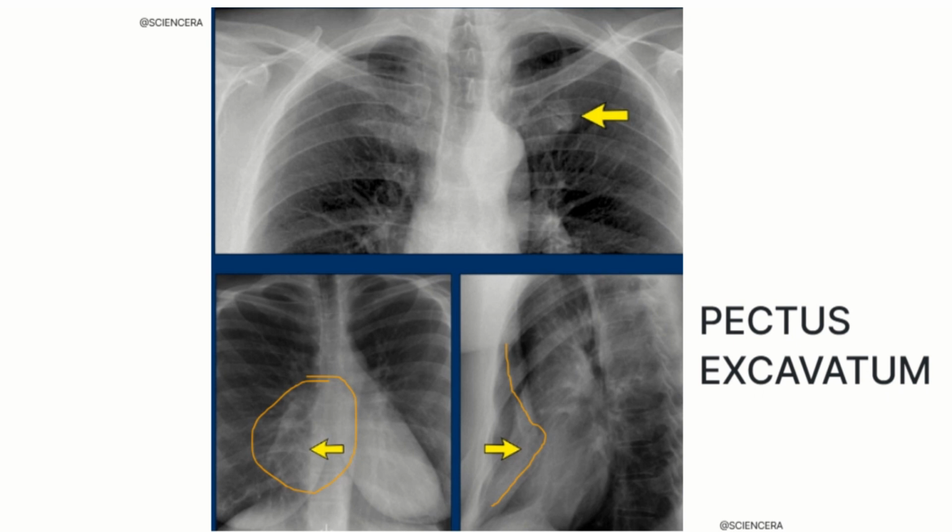the chest is shaped. Pectus excavatum again is something some people are born with, and while it might look a bit odd on an X-ray, it's not a big problem for their health. And pectus excavatum means the chest is concaved inward.